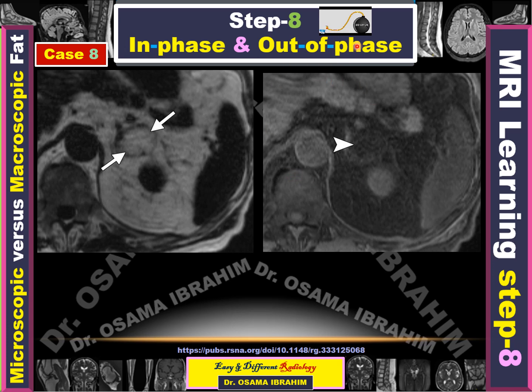Next case, are you ready? Is there any opposed phase or out of phase in these two images? Look at the boundaries. Time out. So if you look, there are no boundaries in both images, so you don't deal with out of phase or opposed phase images.